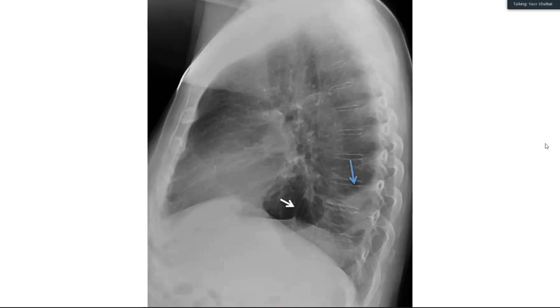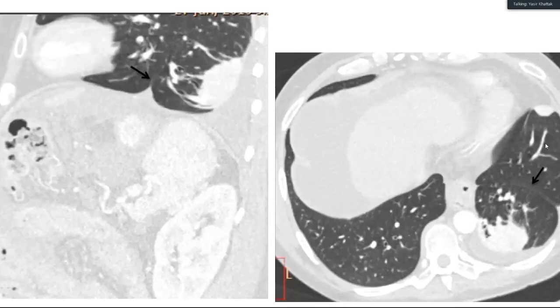All right. So this was actually a case of round atelectasis. We put together a rounded lesion, loss of volume, and pleural thickening, and what comes to mind is atelectasis. The reason I said volume loss is important is because it favors this particular diagnosis. In round atelectasis, there is a displacement of the major fissures, thickening of the pleura, and a curving appearance of the vessels pointing towards the atelectasis.